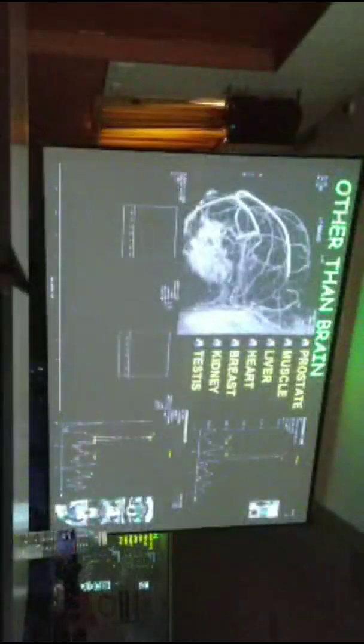It is also morphologically malignant. But this is an MR spectroscopy. We zoom in and you have to look at one magic area, that is 3.2 ppm. If the choline is elevated, then we call this tumor malignant. So again, it is very important. This area number is 3.22.